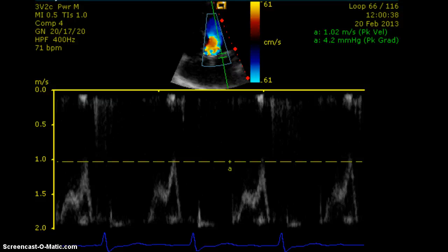Okay, we will now discuss some Doppler techniques, and for case 3 we will demonstrate some incorrect Doppler, specifically baseline placement, scale, and correct caliper measurement placement. In this image, if you look up at the 2D color flow image, we'll see that this is actually a 4-chamber view, mitral valve, pulse wave, attempting to measure mitral valve inflow.